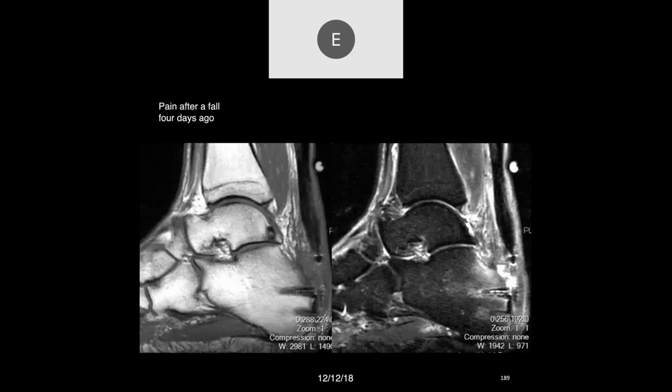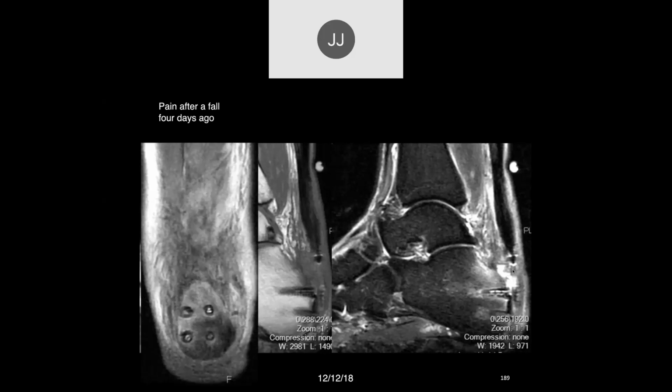Yeah, so right, looks like they've secured this Achilles to that insertion site. I'm not seeing all of it. Certainly a lot of edema there now. I wonder if there's a tear. Why are you wondering? Oh well, I don't see all of it. Is it a tear? We didn't see it on all the images, but these are the characteristic images.